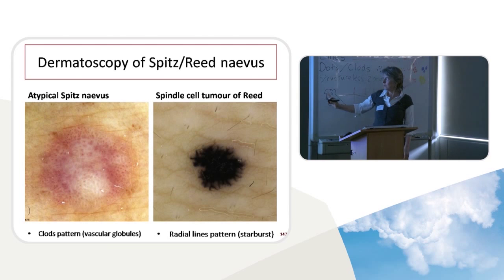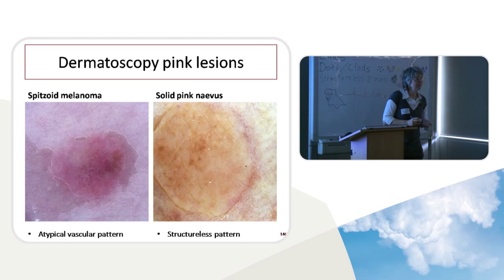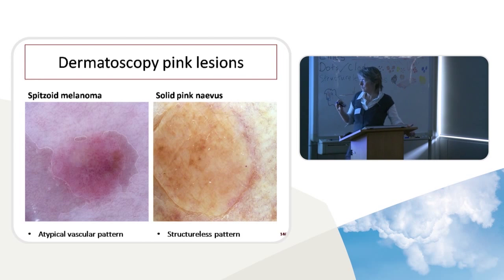And a benign one, and that's a spitzoid melanoma. Okay, so we had a Spitz benign, and this is a Spitz melanoma, and there ain't much difference, right? So the message is, do not handle Spitz, refer on. Let me deal with it.